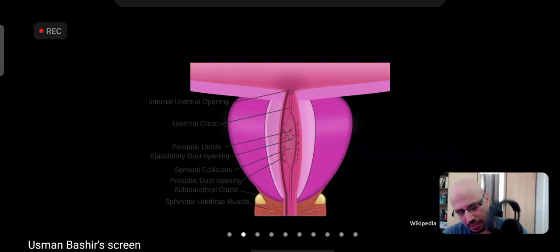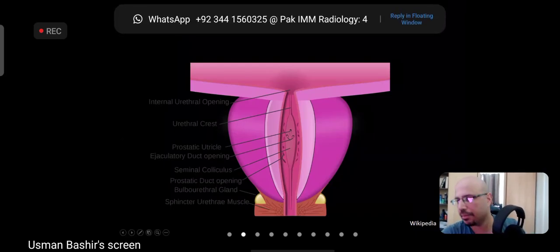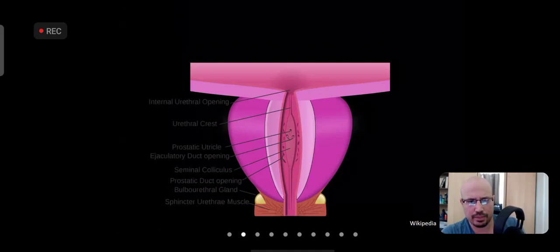Now I'm gonna just show the MR and speak with reference to it.